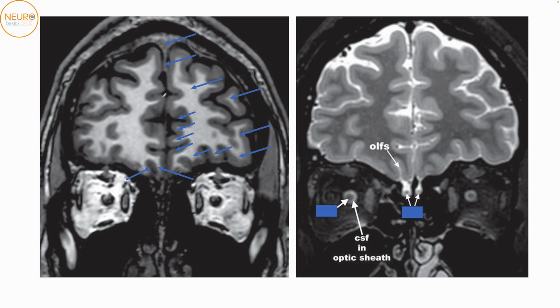Okay, so we know that the superior frontal gyrus runs all the way from the inferior to the superior surface. So this first thing that we are seeing here is the superior frontal gyrus. This will be the middle frontal gyrus. Okay, so that is very easy to notice. Apart from that, here this is the cingulate sulcus, and this is the rostral sulcus. There's something known as a rostral gyrus which exists on the medial surface. So here you have the cingulate gyrus, below which you get the rostral gyrus. This is the superior frontal gyrus.